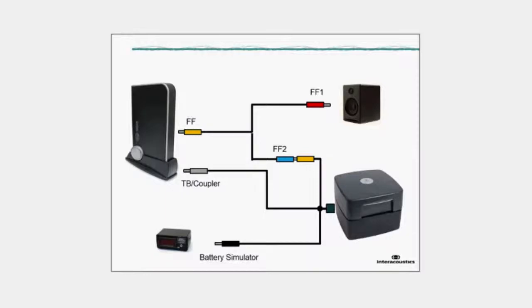Should you wish to connect the TBS-10 to the Callisto for HIT measurements and RECDs, but also use a loudspeaker for REM measurements, you can do this by using the existing Y cable and connecting it as you do with a single speaker as normal, and then attaching the TBS-10 by connecting the yellow FF plug into the FF2 port.